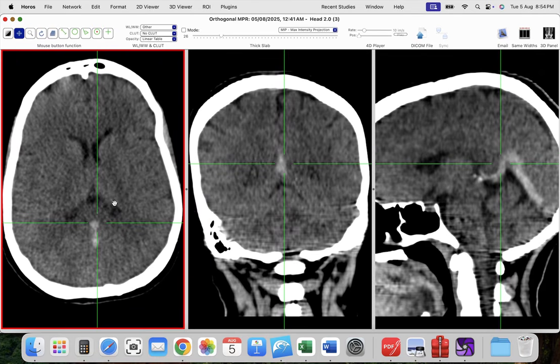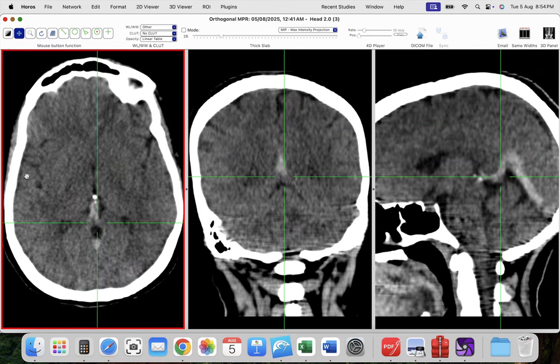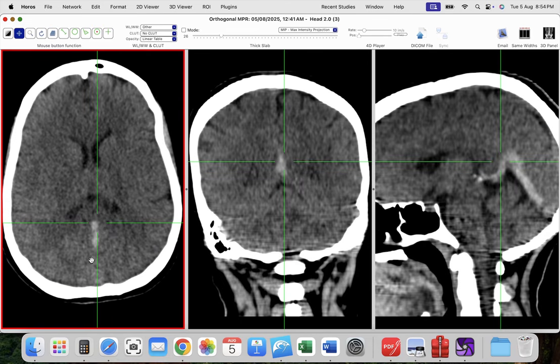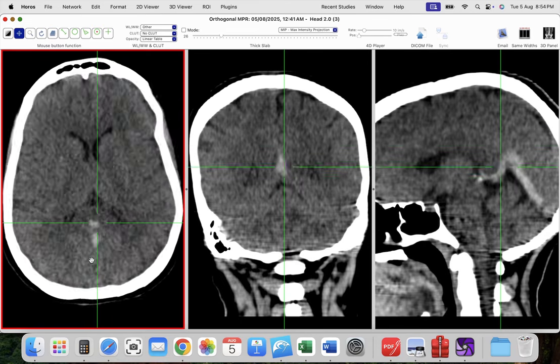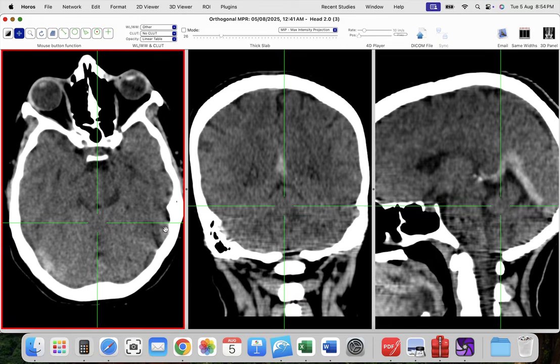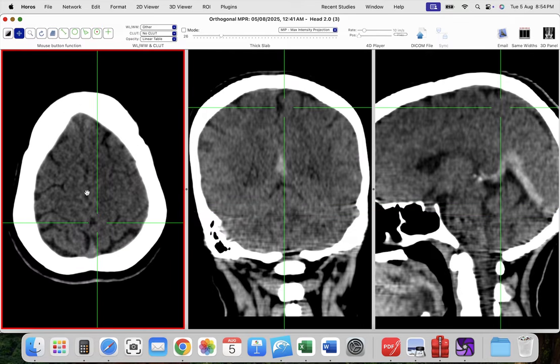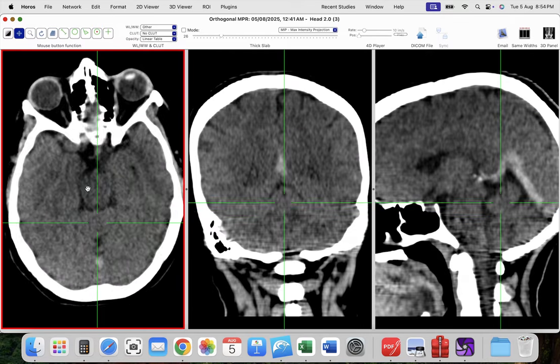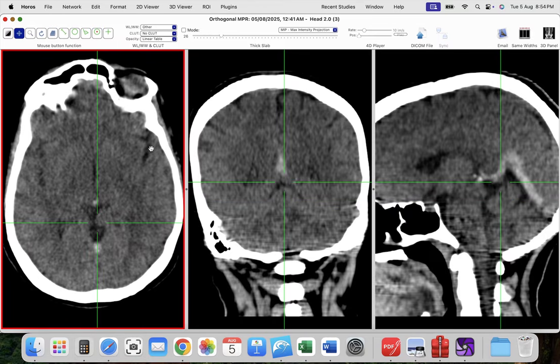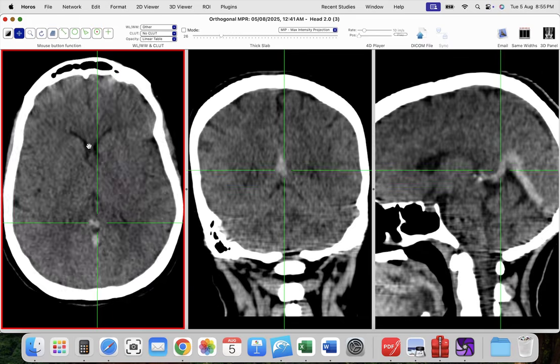Now we come to the negative data that you should mention in the report. No hypodensities in the brain, no hypodensities in the occipital regions, as well as there is no thrombosis of the left transverse or sigmoid venous sinuses or the superior sagittal sinus. Fortunately, there is no sign of brain edema. The Sylvian fissures are open, as well as the high cortical sulci.